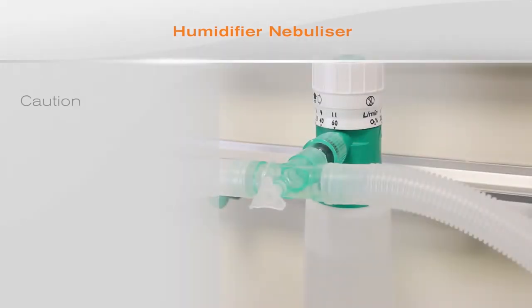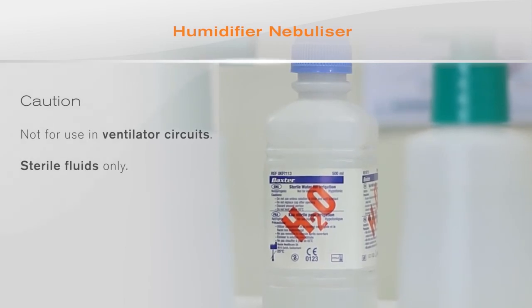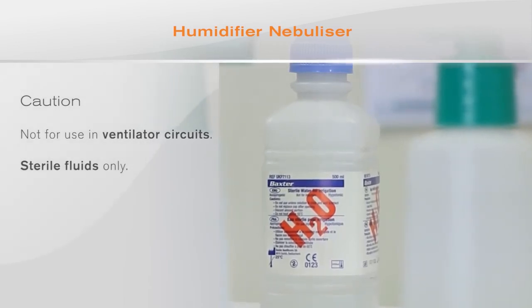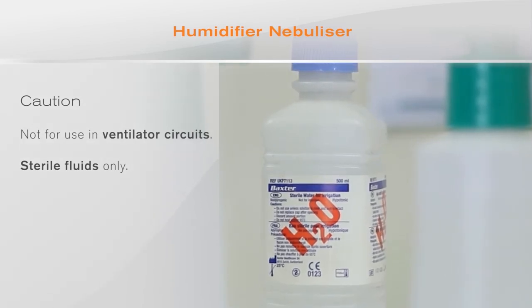These devices should not be used in ventilator circuits, as the air entrainment port will introduce a leak into the system. These devices should also only be filled with sterile fluids that are changed every day. Any residual fluid should be drained from the bottle and discarded before refilling.